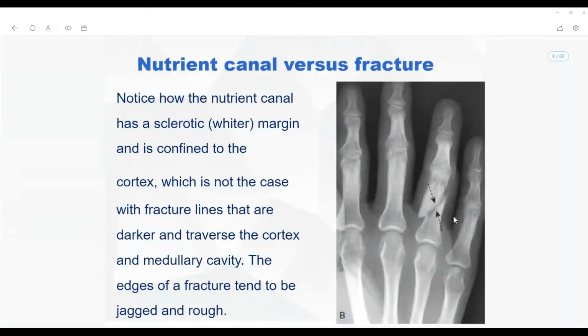Or he has been hit with a rod only at that point of time. Most of the time, blunt force injuries actually happen. How can I actually recognize it? I can recognize there is a swelling of the soft tissue, and you see here there is a disruption of the smoothness of the soft tissue, first thing.